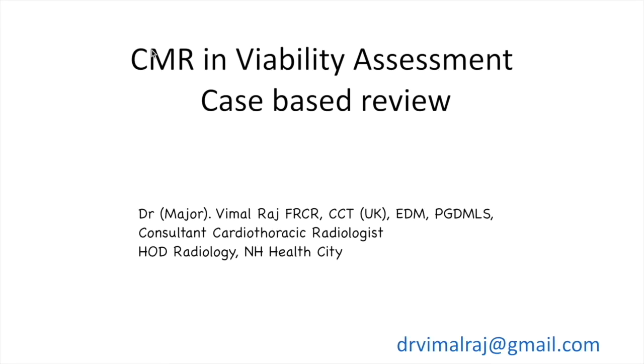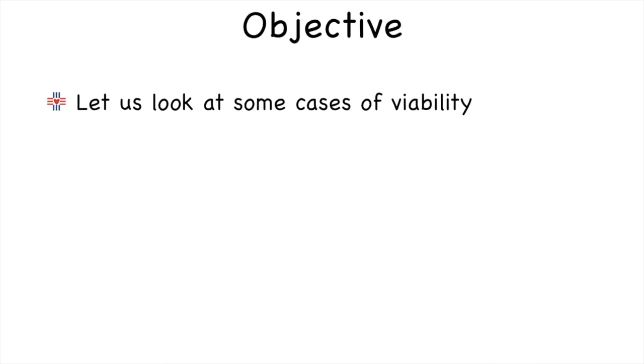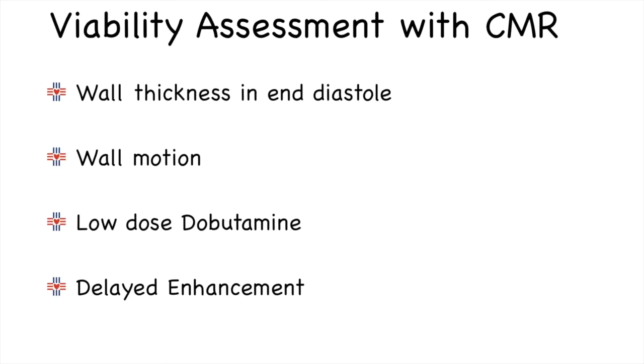Welcome to this session on case-based review of viability assessment. I hope you've gone through our previous learner series on viability assessment and how it is done in cardiac MRI. The objective of this session is to look at some cases of viability. Prior to looking at this, just a quick summary of how we use cardiac MRI to assess viability.